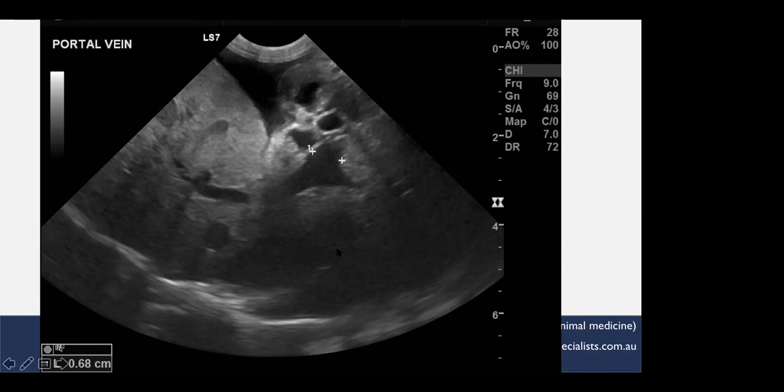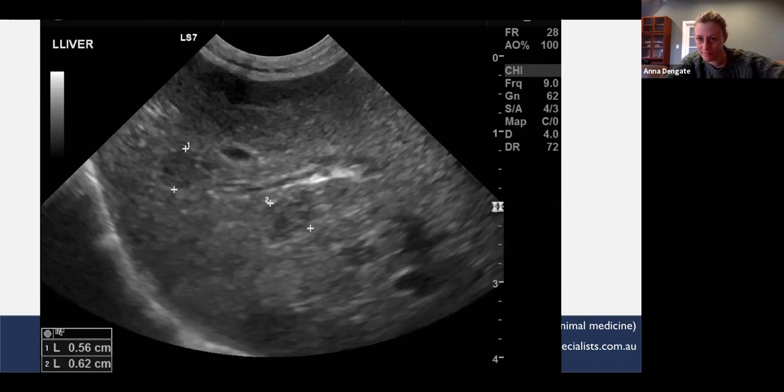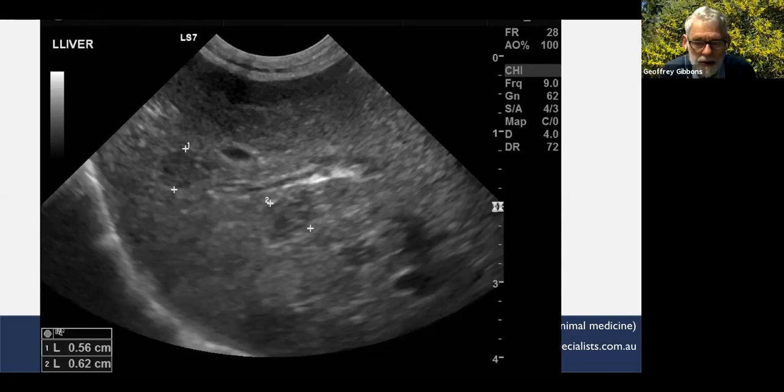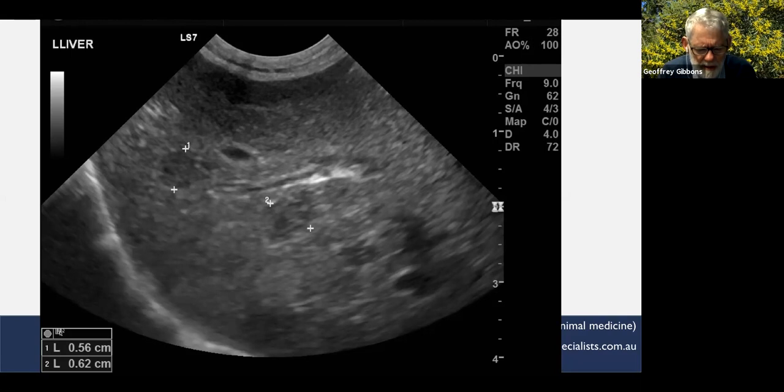Okay. Yeah, it could be pericardial effusion. Yeah, absolutely. Heartworm. Yeah. Infiltrating tumor in the cardiac wall. Yeah. Maybe hypertrophic cardiomyopathy. Potentially, yeah. No pleural effusion though. What else have I got? Mentioned heartworm. That's less common in cats. Yeah, I'm exhausted for ideas there.